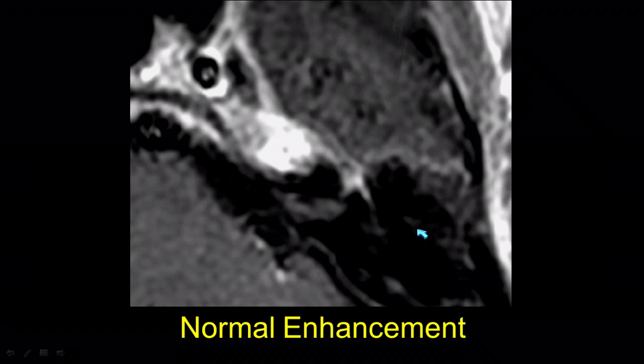Now we do have kind of a pseudo-lesion of normal anatomy. We used to think that any enhancement along the facial nerve was abnormal, especially when we're just on 1.5T. As soon as I put in our 3T, I was seeing facial nerve enhancement on every case. So we're living in a time that our technology and computers are advancing so quickly, we have to be able to learn, unlearn, and relearn material as we're seeing this anatomy better and better all this time.